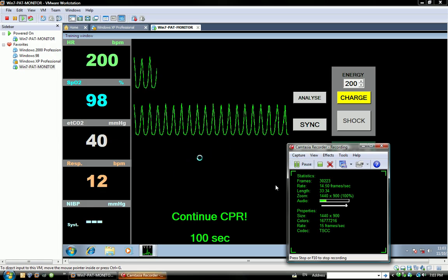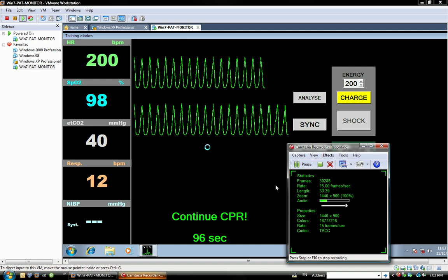This is especially common in most defibrillators, because they say that a shock is not advised unless the rhythm is more extreme, in a VF state, and the defibrillator is capable of charging and a shock is advised. Unless this happens, it will ask you to continue CPR again.